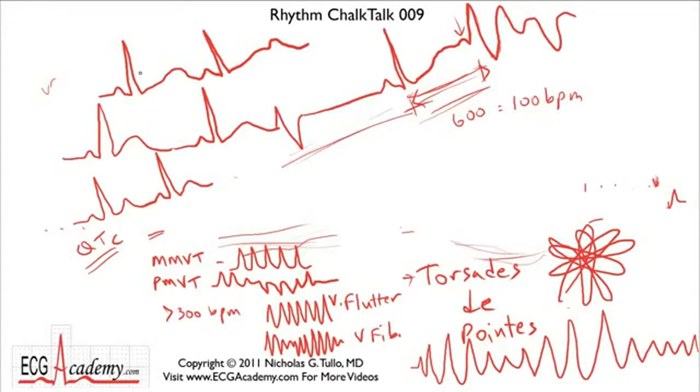So you've got the long QT, you've got the pause dependence, you've got the bizarre T wave after a pause, and the first beat of tachycardia is widely coupled and it arises from the TU complex, and of course it's polymorphic at rates usually in the range of 150 to 200, sometimes 220 beats per minute.